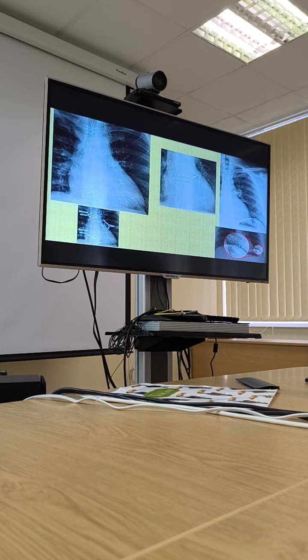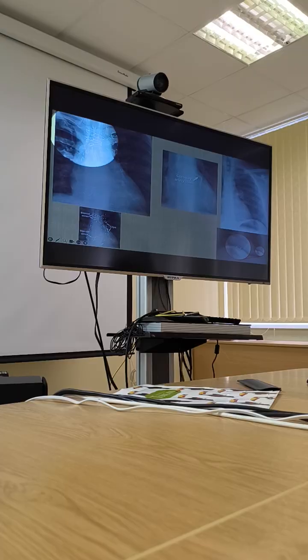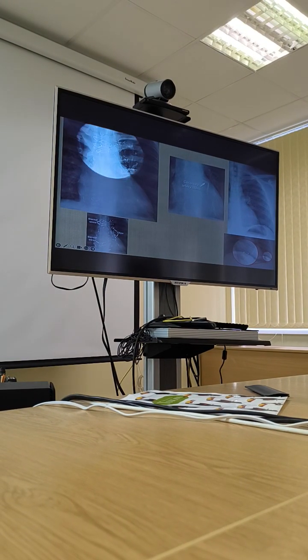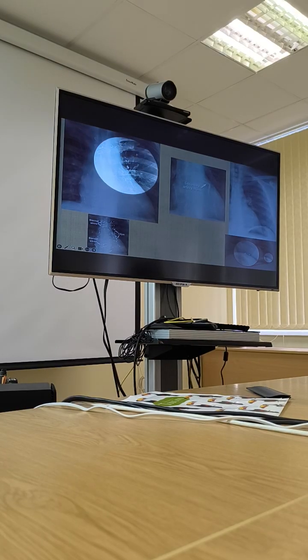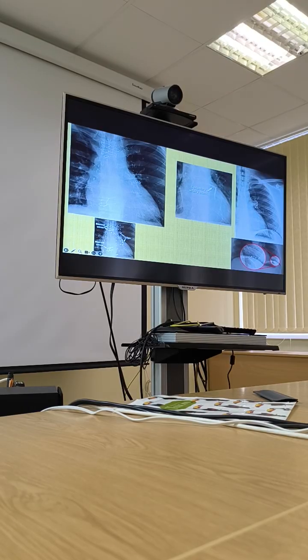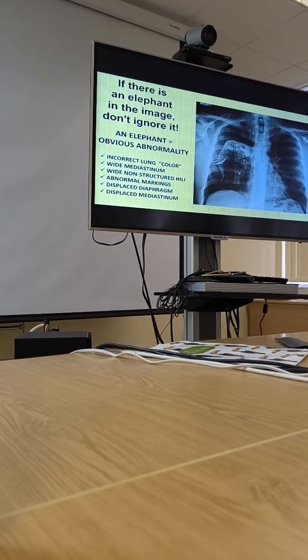Let's figure out some other stuff. We used to see in a couple of pictures this sternum suture, and what do you think these white short lines are?